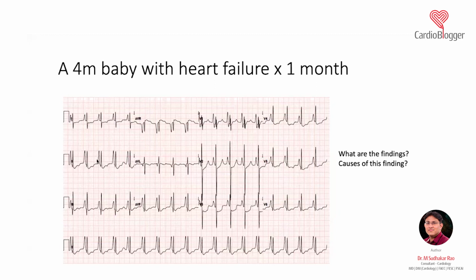But if you see this ECG, there is a P wave which is almost 10 mm. We have a cutoff of 2.5 mm for P pulmonale, that is a right atrial enlargement. But now when you come to this side, you see that there is a right atrial enlargement, but there is also a negative deflection. Now I again told you the negative deflection of the P wave in V1 can be a right atrial enlargement also, or a left atrial enlargement also.